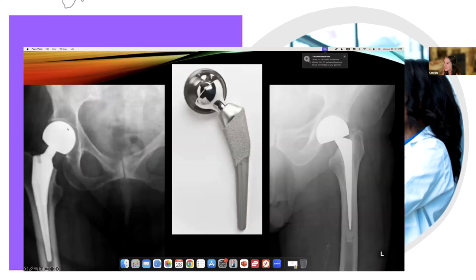In these cases, they typically go with a hemiarthroplasty. Hemi, just half of the joint is replaced, because if you check this, the acetabulum itself is actually still native. And this definitely changes the management. So you want to give all the details possible in the report, because whatever we are describing and the findings that we are relaying to our colleagues are going to define the management.